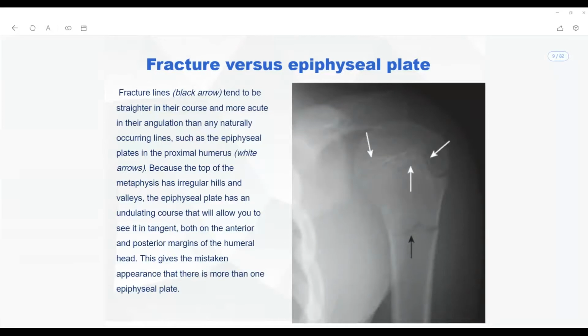And you have to also understand that most of the fractures generally happen along the distal edges. Okay, proximal edge fractures also happen. Most of the times, yes, the fractures happen along the distal ends of the bones. Generally, but not standardly, but generally they happen along the distal ends of the bone.